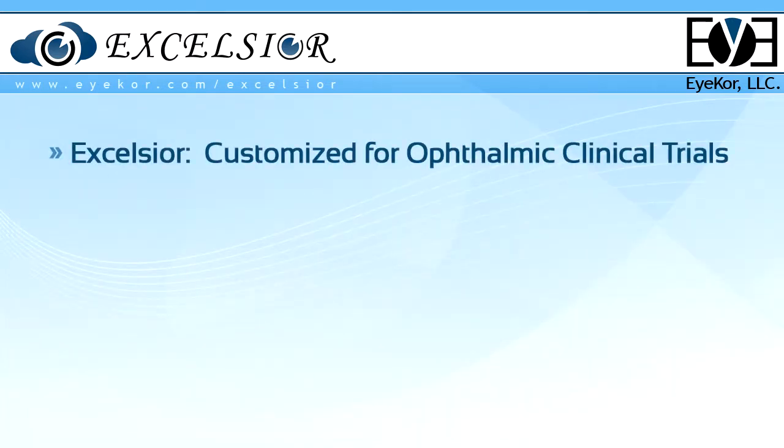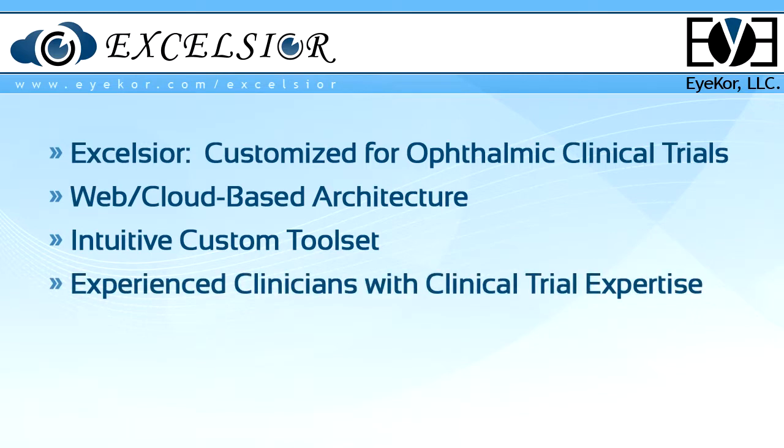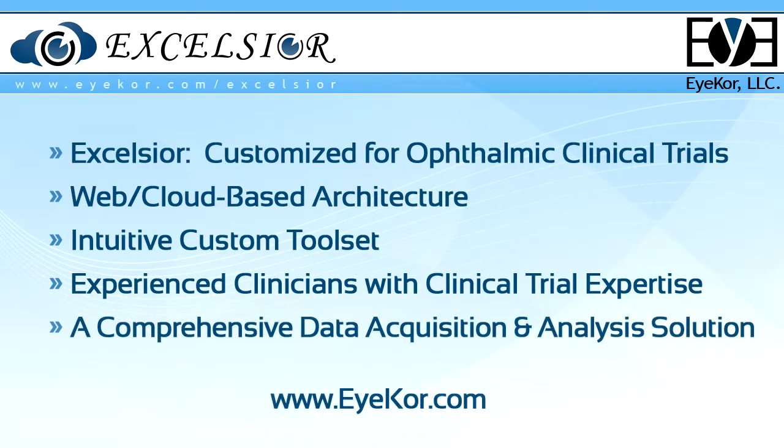From acquisition to final analysis, EXCELSIOR is specifically geared toward meeting the demands of ophthalmic clinical trials. EXCELSIOR leverages its web-based architecture, an intuitive workflow with a custom tool set, and an in-house network of highly skilled clinicians to provide faster, more accurate results across multiple test modalities in an accessible and transparent way. EXCELSIOR is the most streamlined and comprehensive software available to help ensure the successful analysis of your ophthalmic clinical trial data.